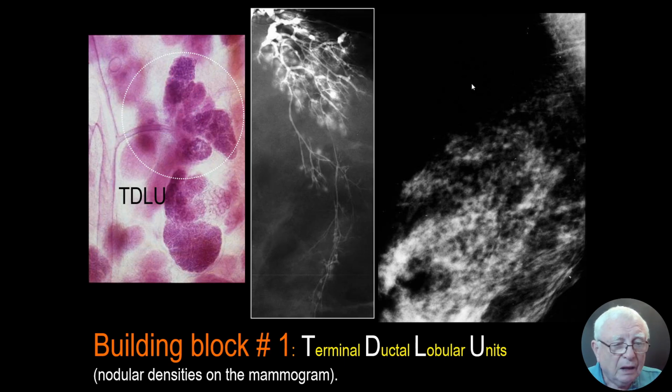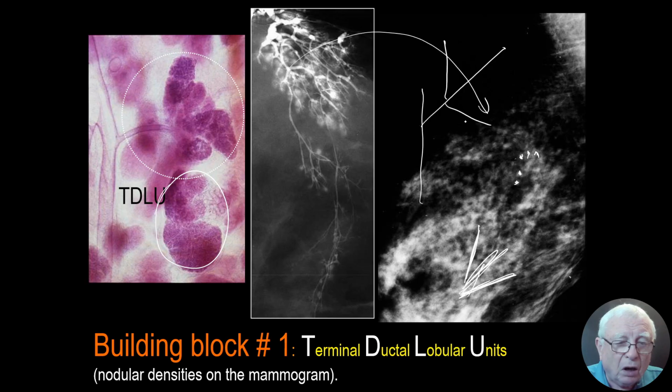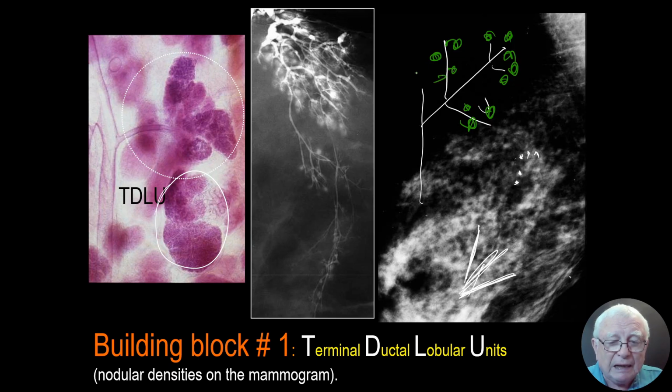singular acinus. Radiologists say, I can see this. And it's here. But it's separated from another one with this radiolucent black. That's fat. And here is another one, and here is another one, and here is another one. Yes, we can see ducts, but just like on a tree, there are few branches, but there are zillions of leaves. And that's exactly what the female breast needs as well, namely a lot of milk factories and just a few ducts.